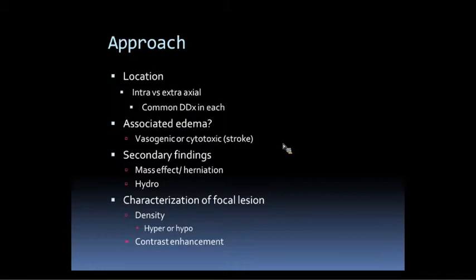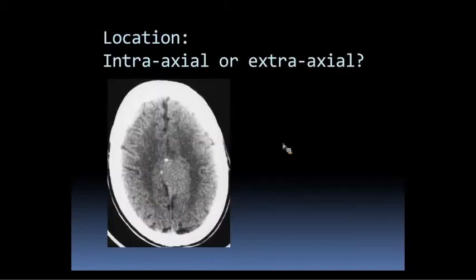And then beyond that, beyond just the parenchymal edema, if there's a focal lesion, we can look at the density of the lesion on non-contrast imaging and the enhancement characteristics of it to arrive at a better differential.